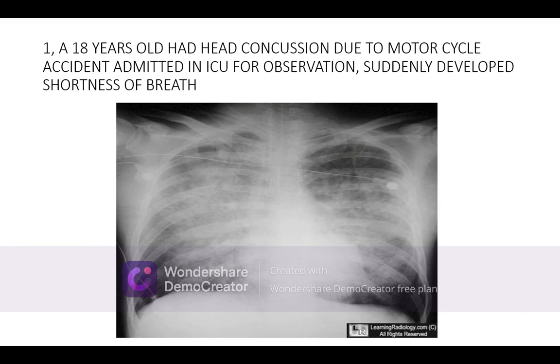Autoimmune diseases can present like this, but again the thick bands of fibrosis are not seen in this condition, so least likely. Then going for the other one, parasitic invasions, etc., are usually unilateral. Loeffler syndrome, for example, as a parasitic invasion, or invasion by Paragonimus westermani, will not cause this type of shadowing.